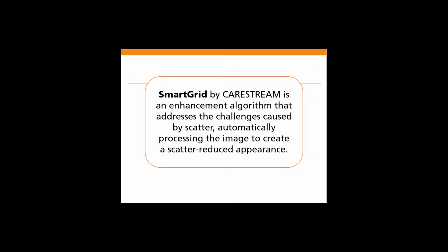SmartGrid by Carestream is an enhancement algorithm that addresses the challenges caused by scatter, automatically processing the image to create a scatter-reduced appearance. SmartGrid can be applied manually, or it may be pre-programmed for easier use. First, we'll look at how SmartGrid can be applied manually.